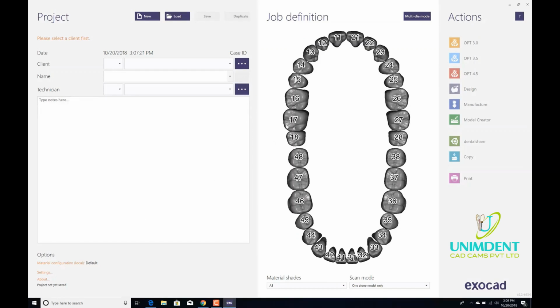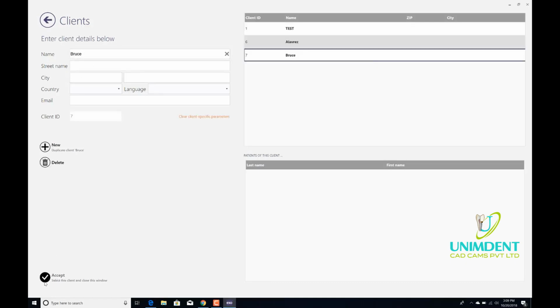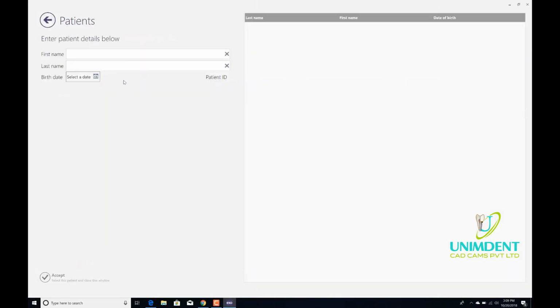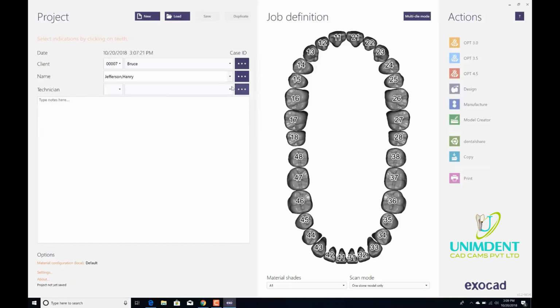So with that said, I will start creating this new project. I'm going to create a new customer, whose name is Bruce. It's just an example. Again guys, I don't want to fill all of this in. Street, city, you can do by yourself. And then the name of the patient could be, let's say, Henry, last name Jefferson. Click new, it's right up here, and then I'm going to set the technician, which is me.